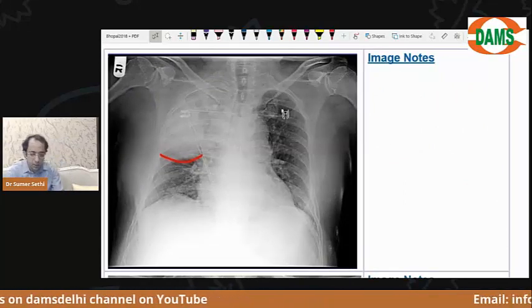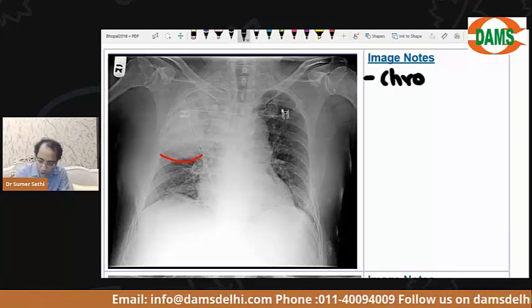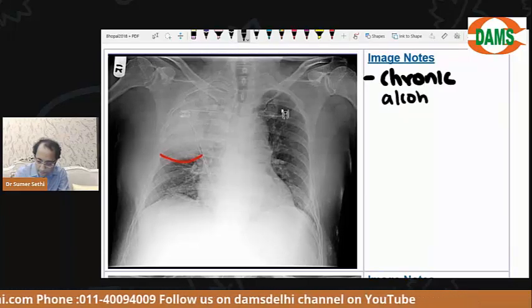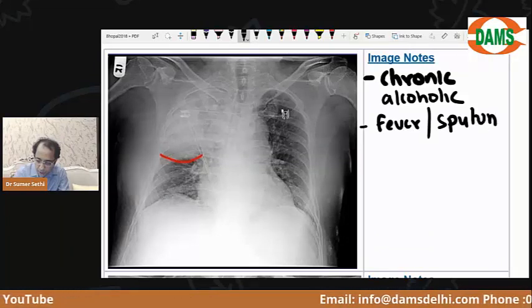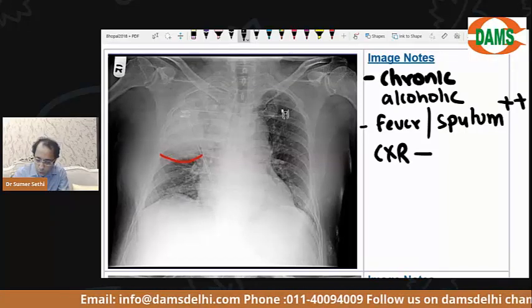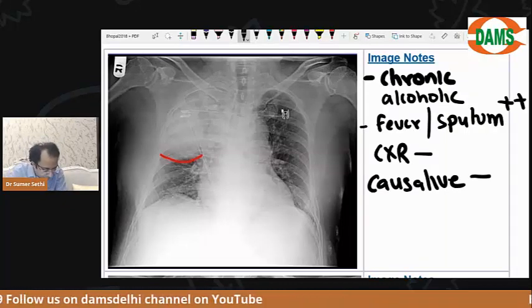Let's see if you can answer. Okay. In the next question, the question is saying a chronic alcoholic comes to you with fever and sputum production. Okay. Chest X-ray is shown to you. What could be the causative organism? Okay. I will explain, beta.